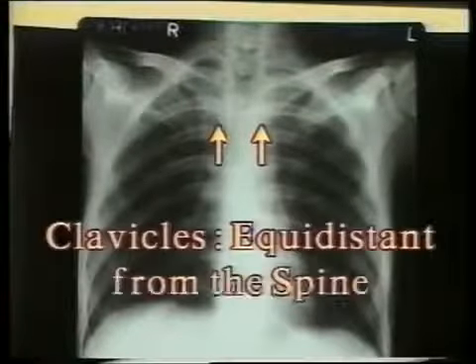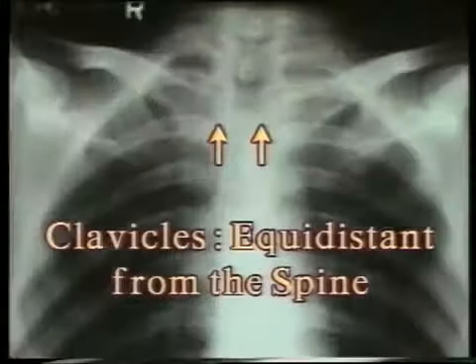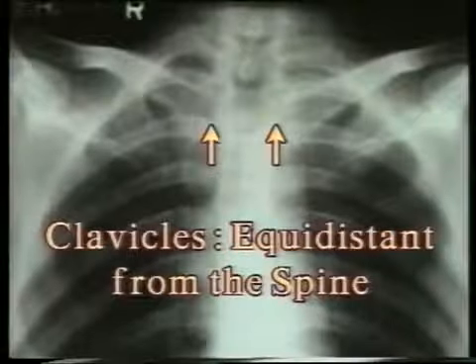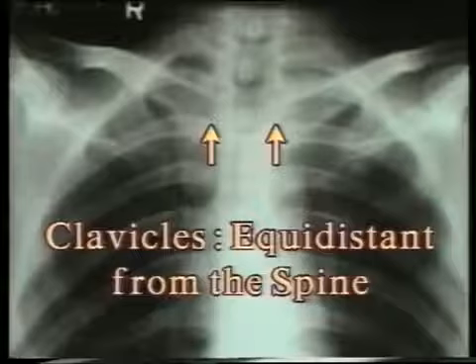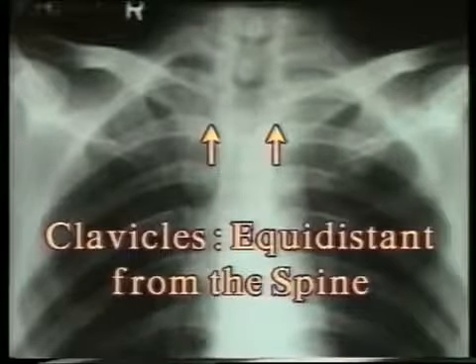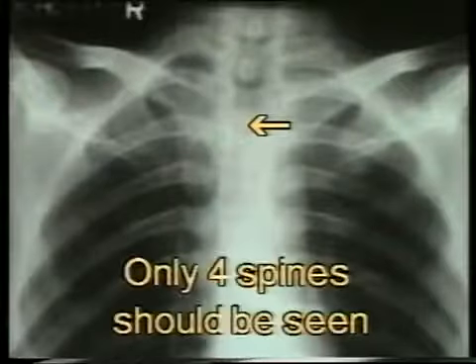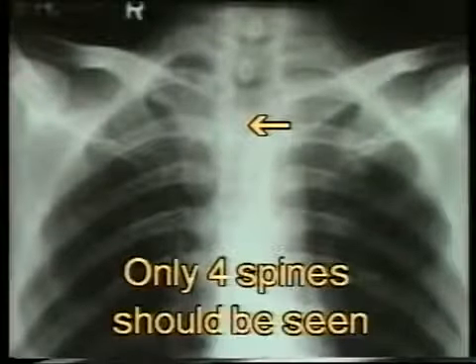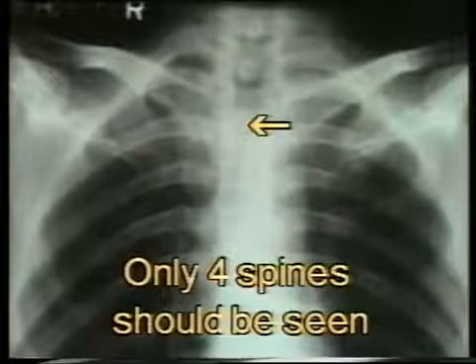In a well centralized film, the medial ends of both clavicles are equidistant from the spine. If they are not, then you cannot make any comment on the mediastinal shift, cardiomegaly, or on comparative radiolucency of the lung fields. In a well-exposed film, the spinous processes of only the first 4 thoracic vertebrae are seen. Others are hidden by the heart shadow. If the film is overexposed, more vertebrae are seen and the lungs appear more translucent.